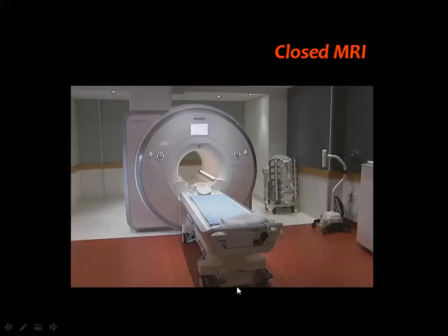Then, as you all know, in order to image the ankle, or any joint in the body, we can have this by plain X-rays, by CT, by MRI, and also by ultrasound. In this topic, we'll handle the role of MRI in assessment of the ankle lesions.